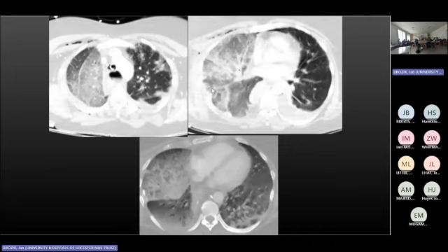This is another case, and this time I didn't bring a chest X-ray, but this is a case that I often show to radiologists because on serial imaging we failed to understand that there was a major problem. So I accept it's only 3 CT slices, but can you tell me what's wrong with this patient? There's something really wrong.